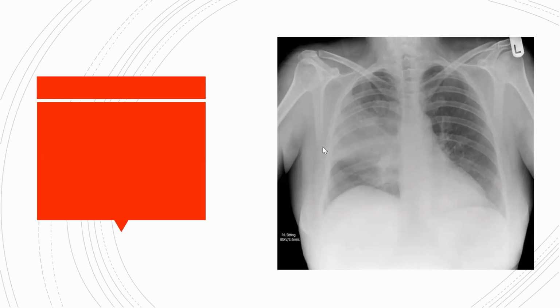Yeah, so someone who said pneumonia was correct. So I think at least I always need to double check. Yeah, perfect. Do you see this sort of big triangle? It looks definitely like there's something there in this triangle that is just whiter than it should be, isn't it? So this we can see in the right middle zone increased opacity that is likely to be pneumonia.